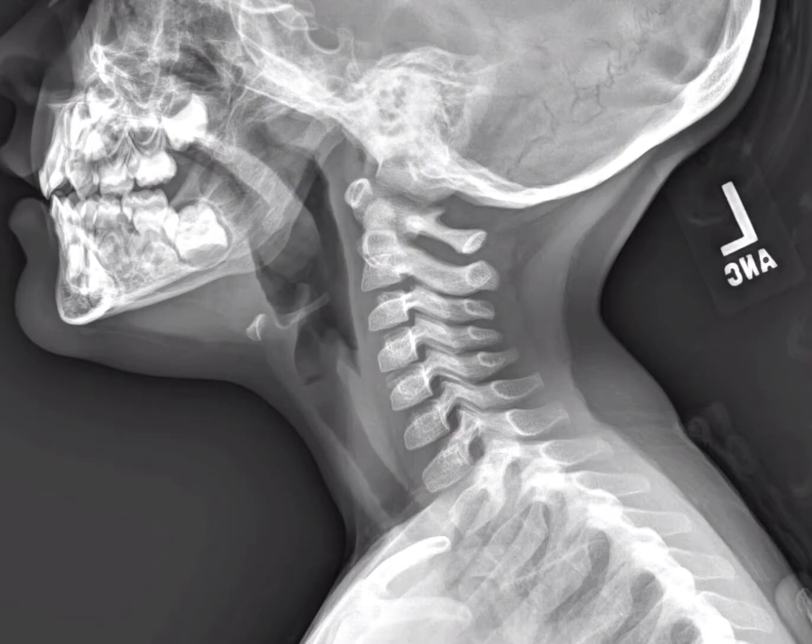If we suspect anterior subluxation of C2 on C3, then another line becomes useful to draw. This is the Swischuk line or posterior spinal line, which is drawn from the anterior aspect of the posterior arch of C1 to the anterior aspect of the posterior arch of C3 right here. This is the posterior spinal or Swischuk line.